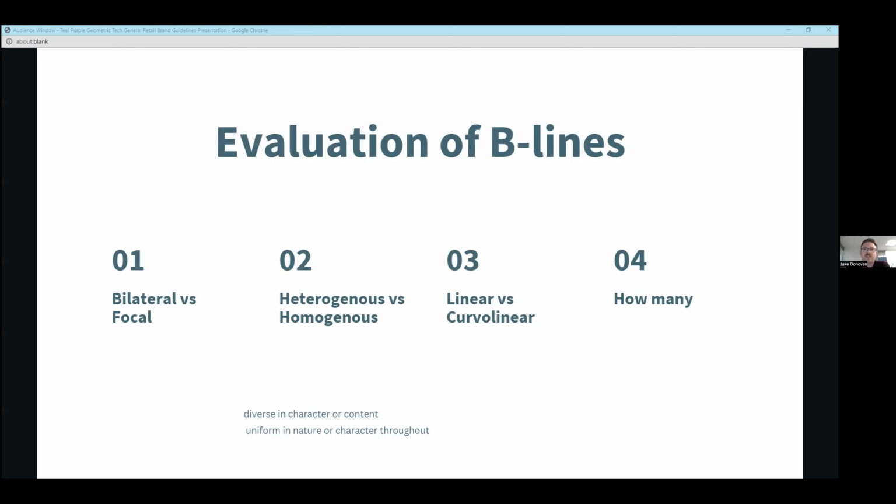Some people say, use the phased array because I'm going to also include the heart in my scan. And that's fine. You can use a phased array. Phased array is good for differentiation of B lines, but it's not good for looking at the pleura, whereas the linear is really what you want to look at the pleura itself and any sort of subpleural consolidations, anything focused on the pleural line itself. You really want a linear probe. But you can also use a curvilinear probe for that.